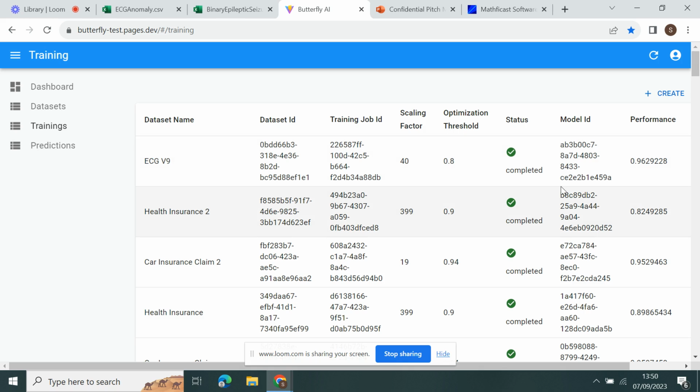And we have this performance which is 96%. We know some of the best algorithms provide 94%. And we are confident that if we increase that threshold, we're going to go even higher in terms of performance. What is significant here is that in almost 2 clicks, we managed to get the models ready to do further training. Now, we can move on to prediction.